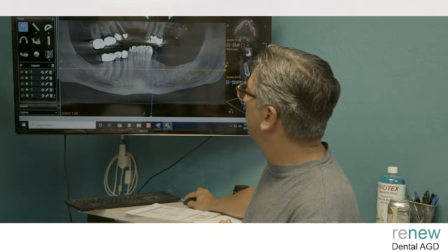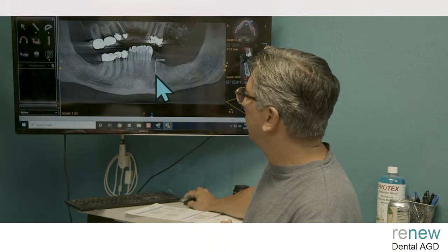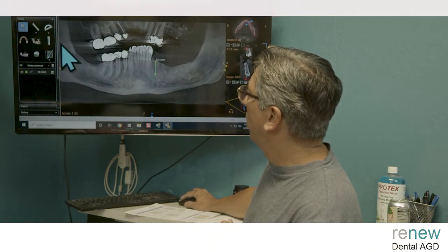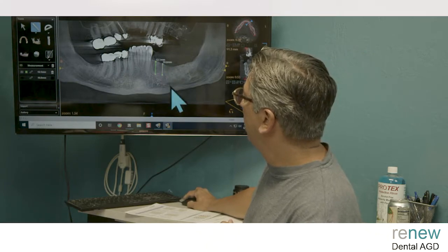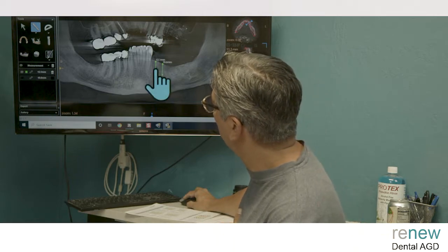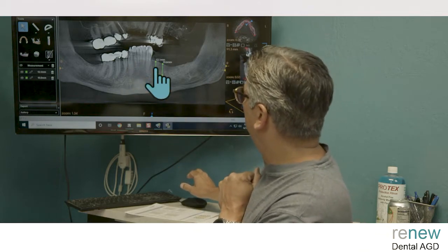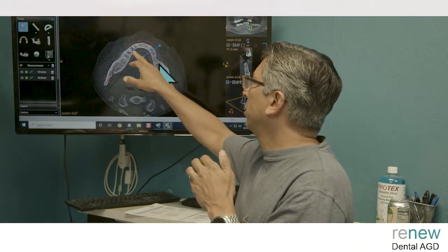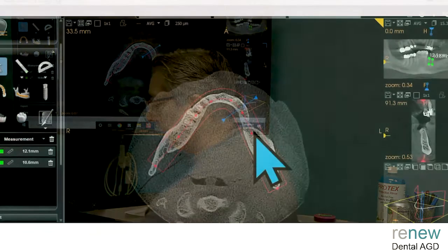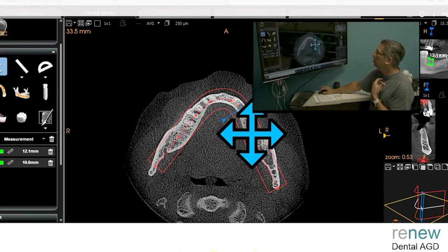Let's say where the first implant is going back would be there. Your second one could be right here at the premolar, and you can see that there are little socket sites. His teeth are really scrunched together. This is a really tight arch through here. He's got a really constricted arch, and that makes it a little more challenging when you try to figure out where the placement should be.